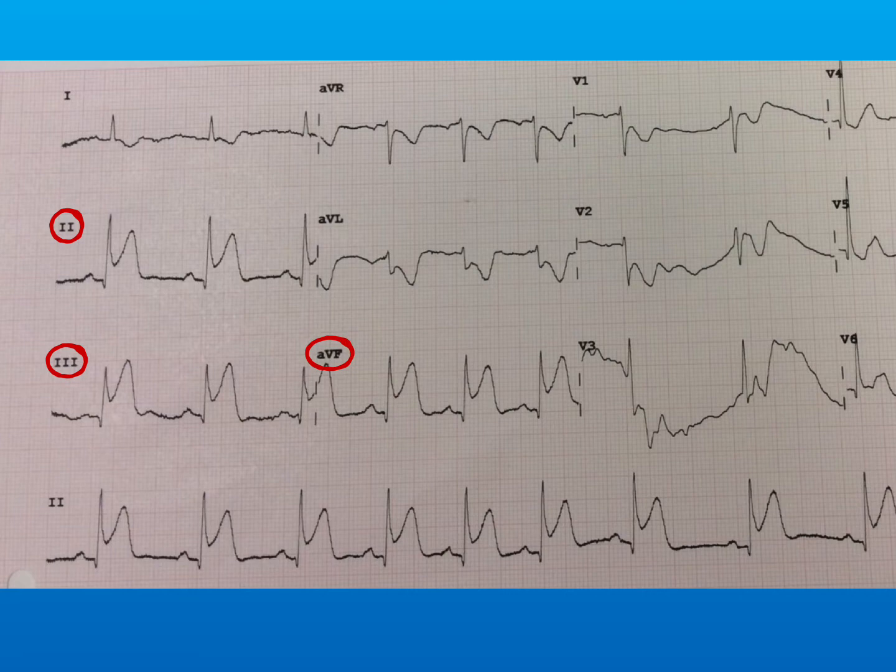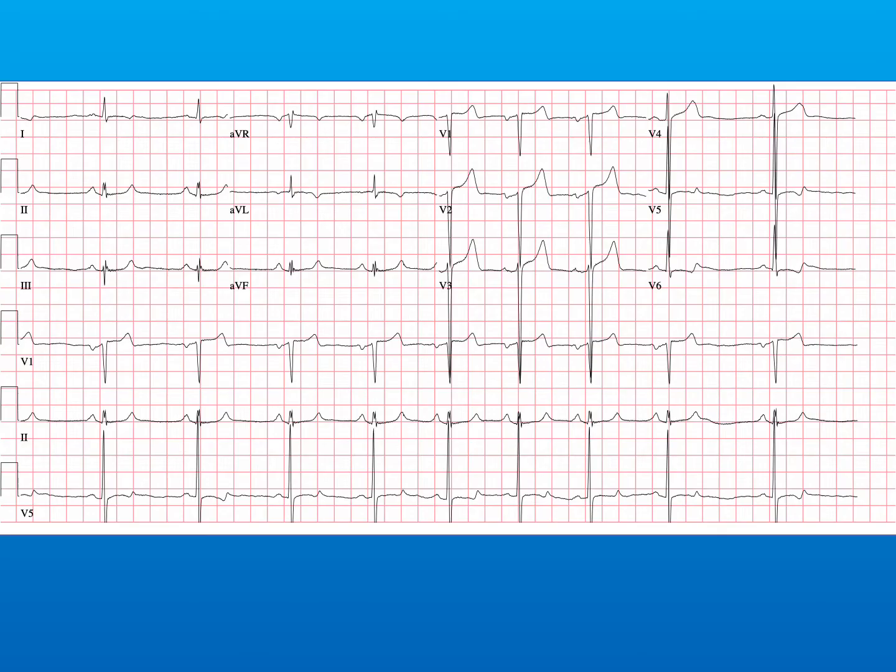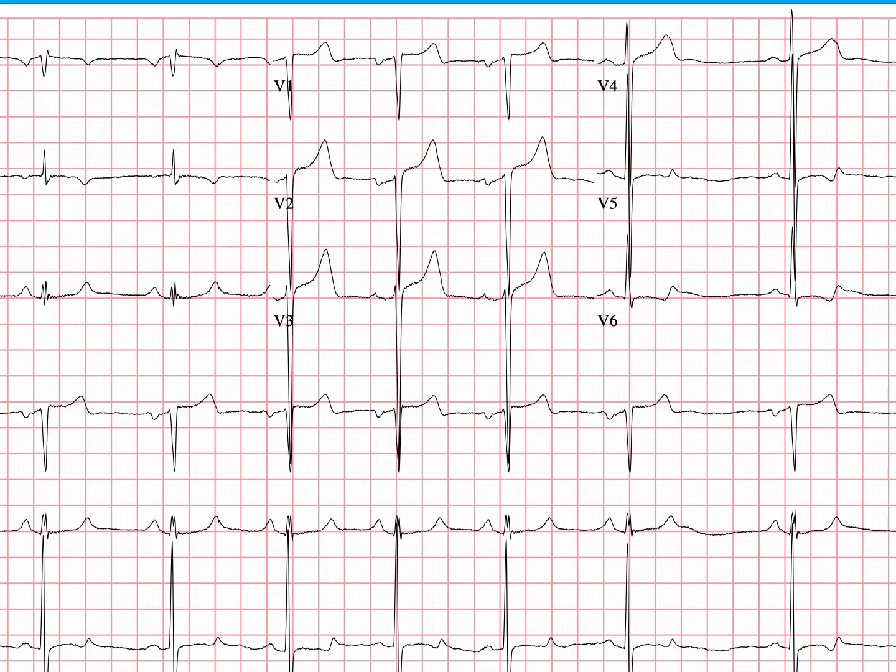Conversely, if we have an electrode on the opposite side of the heart, we're going to see ST depression. Now, this is what we call reciprocal changes, and it's very important because it dramatically increases the specificity for diagnosing a STEMI. So what you're going to need is ST elevation compared to the TP segment in two adjacent leads and, if possible, reciprocal changes.